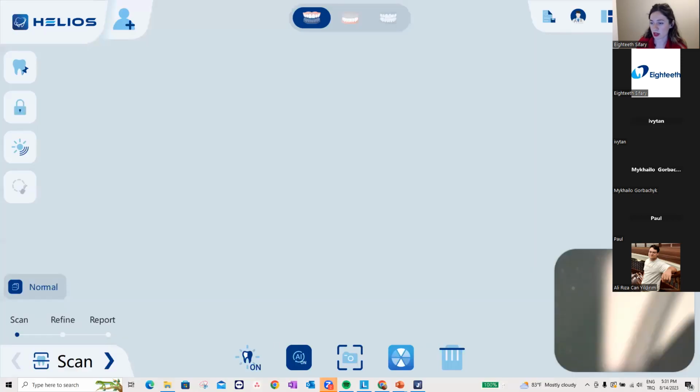Sorry, where is the soft tissue removal filter? Yes, let me show you again. I hope you see my screen right now. On the screen page, there is an AI button, and if you click this one, it turns off, which is available.